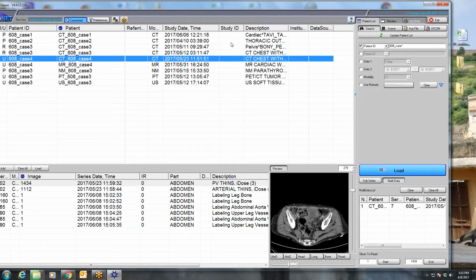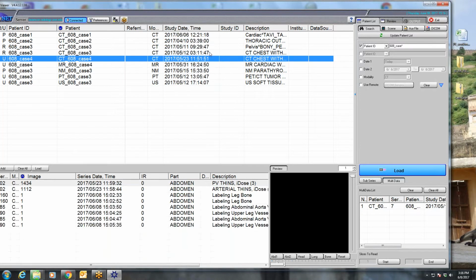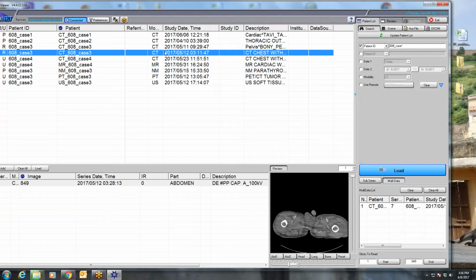When we talk about delayed enhancement, we use subepicardial, subendocardial and mid-myocardial. But when I use epicardium, it's predominantly all the cardiac structures that are deep to the pericardium but outside the myocardium. If that makes any sense. Other people may have different usage, but that's what I use to describe it.